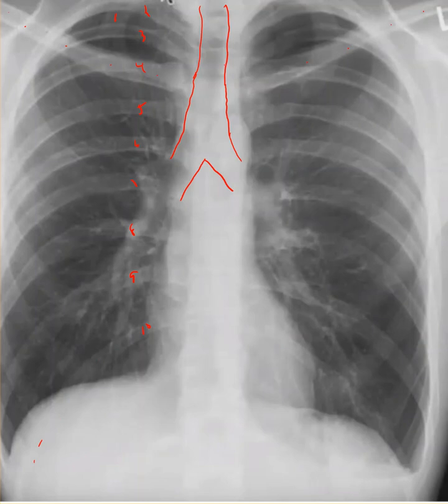Then we look at thoracic vertebrae, and what we can see looks okay. Looks like I don't see any compressions. It can be difficult to tell a fracture on a standard film without getting the thoracic view, but we can see here's where the second rib meets it. So this is second, third, fourth, fifth, sixth thoracic vertebrae. Looks like the carina is right about T6. And so that satisfies our B for bones.